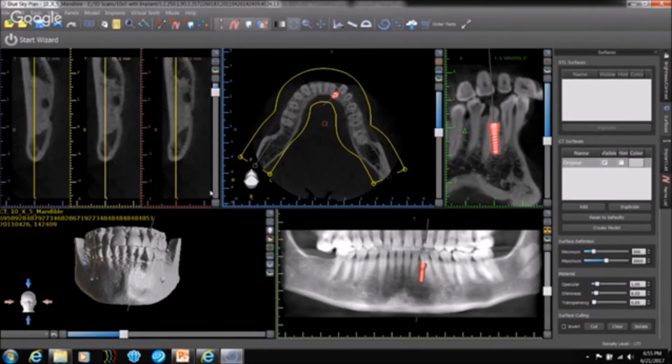Now, this is just an anatomical variation. There are a lot of other pathologies that happen, but in this case, it's not that. It's just a dense bony island.